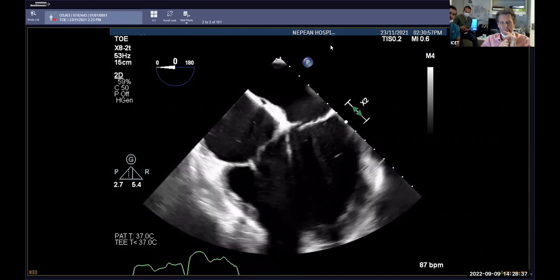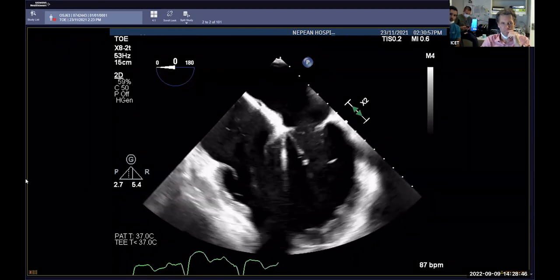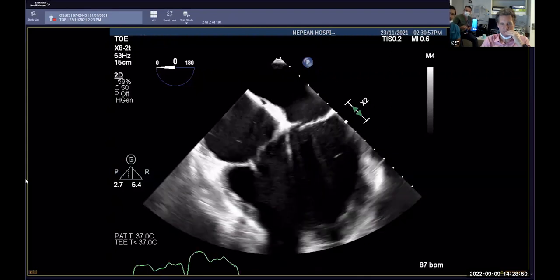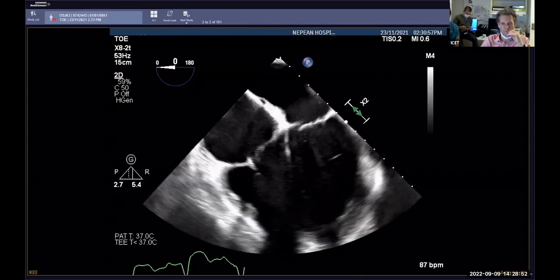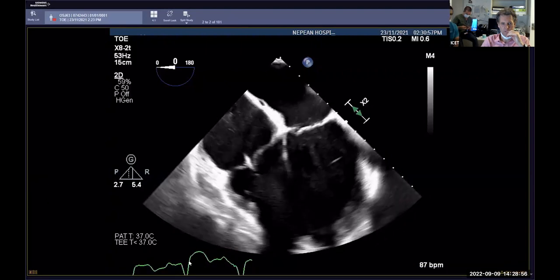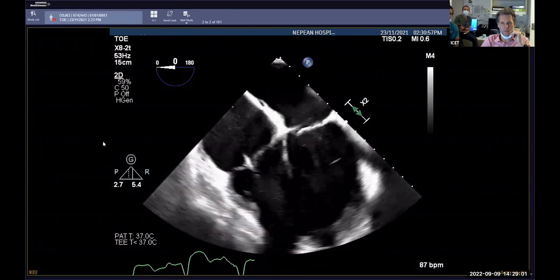It also appears to be a foreign structure in the right ventricle perforating through the tricuspid valve. Clearly, I don't know anything more about this patient. This could be multiple things. It could be a pacing wire, it could be a right heart cath, but I don't think he's in the critical care unit. But he's got a broadened QRS complex, so this is most likely to be a pacing wire. Beauty.